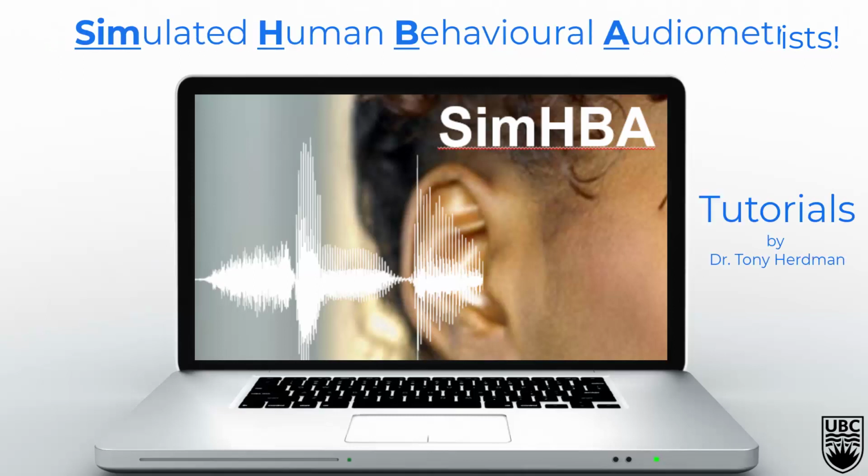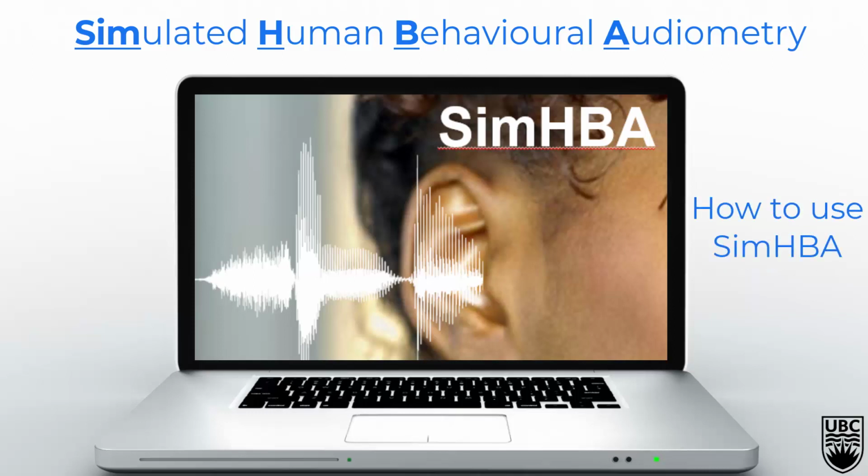Welcome to SimHBA, the Simulated Human Behavioural Audiometry software. In this tutorial, we're going to learn how to use SimHBA, so let's get started.